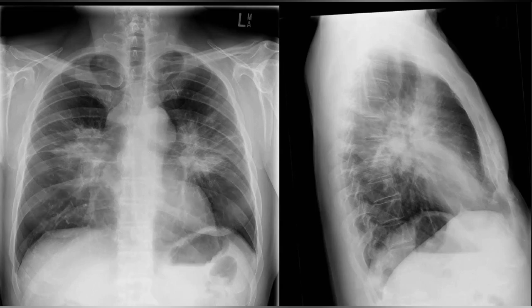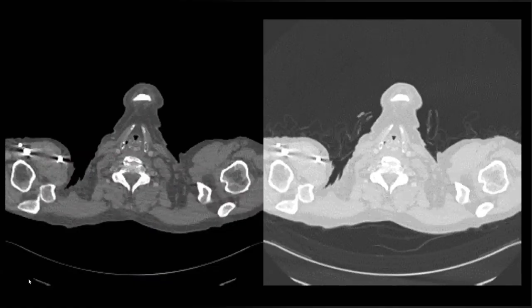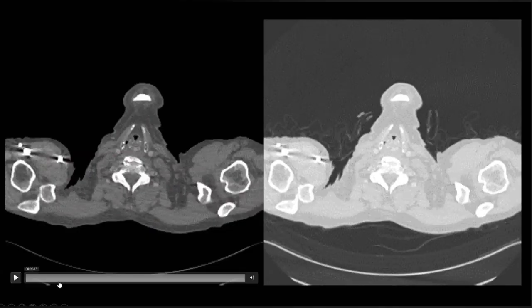Sir, it could be post-infective. Post-tuberculosis, yes, but this is not a case of tuberculosis. You know that I'm showing you cases from Canada, and they say that they do not have tuberculosis over here, but I have seen a few. So let's quickly see the CT scan.